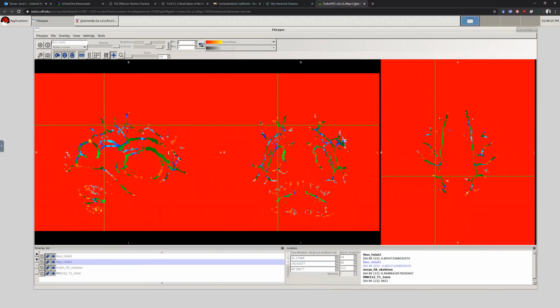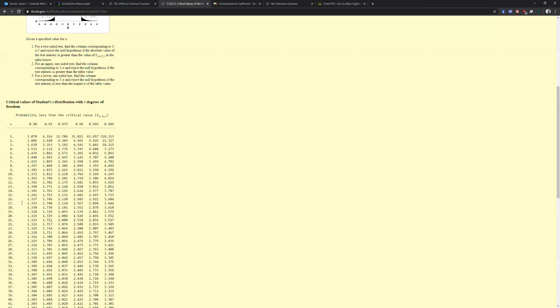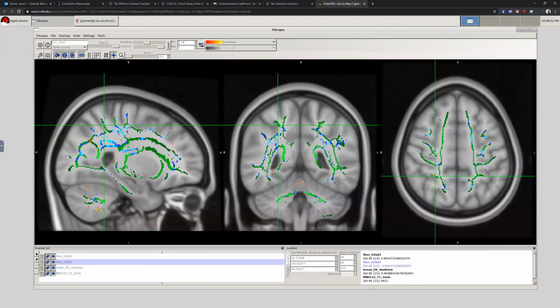We're going to see sort of red everywhere. And then if we put it at 1, we should have more areas where it's red. Notice we did 1.77 and they went away. If we want to be a little more robust, again, we find our other critical value. Let's do our 2.16 as our minimum.